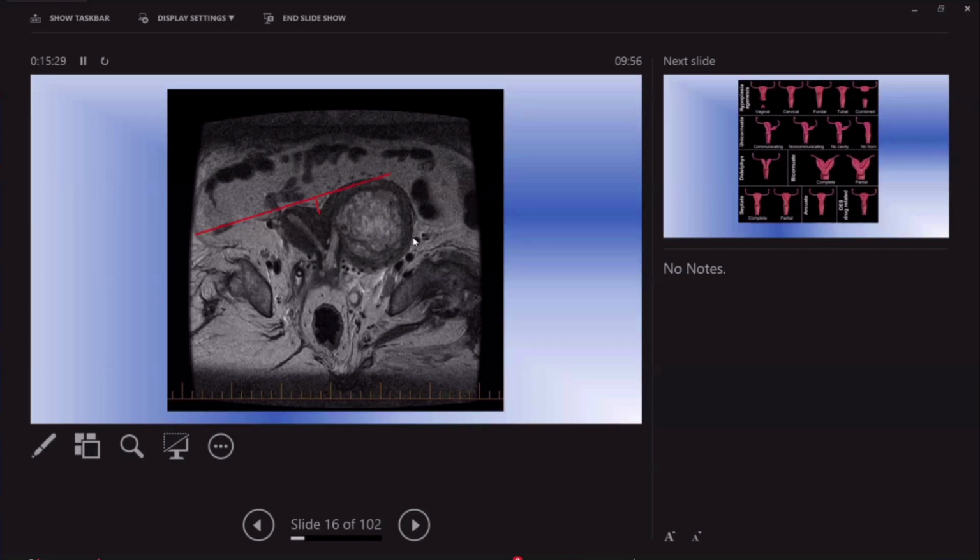And there is a way to differentiate between these differential diagnoses on ultrasound and MRI, and I will show you some cases later. So in this case, you have an endometrial-based lesion with heterogeneous signal intensity. The differential diagnosis is the one I just mentioned. Based on the findings on the MR, the signal intensity is slightly heterogeneous. You can see that there are areas of low signal intensity. So I would check the enhancement.